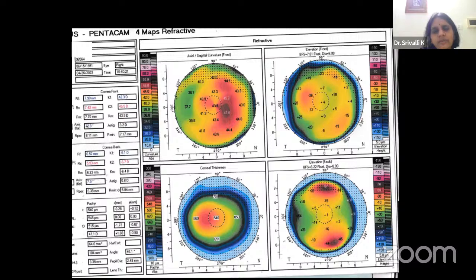So now we ask Dr. Anil whether we are correct or not. Anil? Yeah. That was a post-refractive surgery patient who came for a second opinion. So, one person had suggested post-Lasik ectasia, even though it was very early in the post-operative period. But obviously, it was not looking like that, because the pachymetry map is different. The posterior elevation is perfectly normal. Actually, the front elevation map also is not corresponding to post-Lasik ectasia. Yeah, it's not an ectasia, but basically maybe it's a decentered ablation.